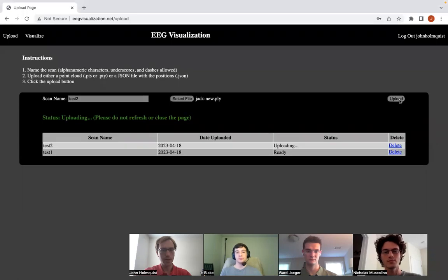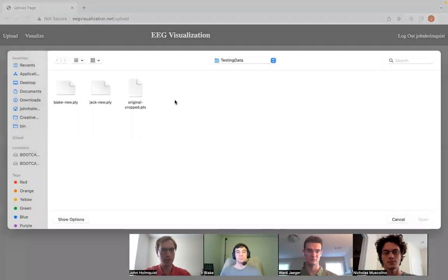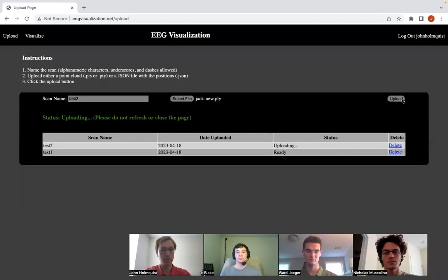So you can see here that I'm uploading a few different scans, and it gives updates as to the progress. You can see here an error actually occurred while we were processing the data, and that's probably because these files are really big and we're transferring them over a network. But if you just refresh the page and try again, as the error message indicates, it will usually work.